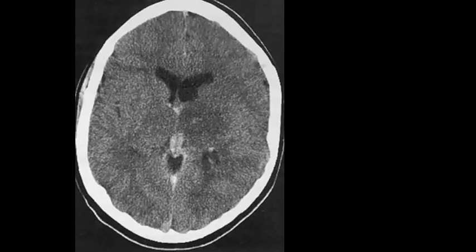Moayed. So Dr. Moayed, when you see anything in the thalamus, go directly and check the internal cerebral vein. And I told you that this is non-enhanced, so take care that here is hyperdense. So hyperdense internal cerebral vein and hyperdense straight sinus.